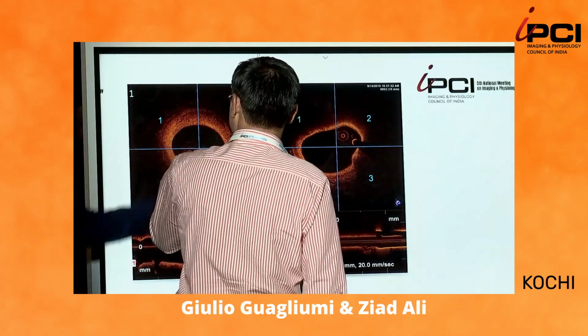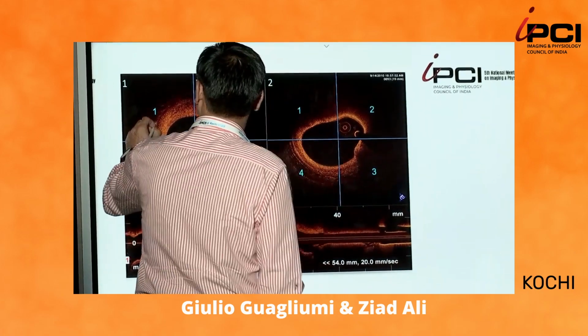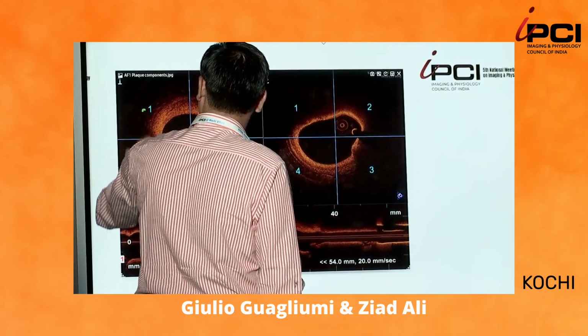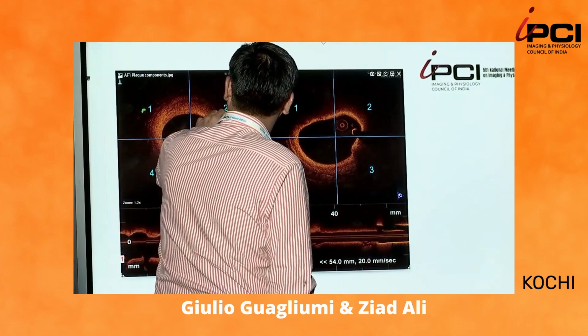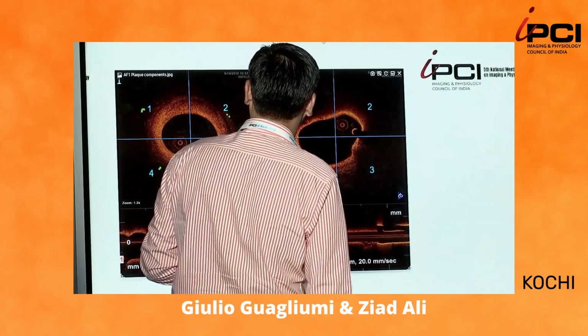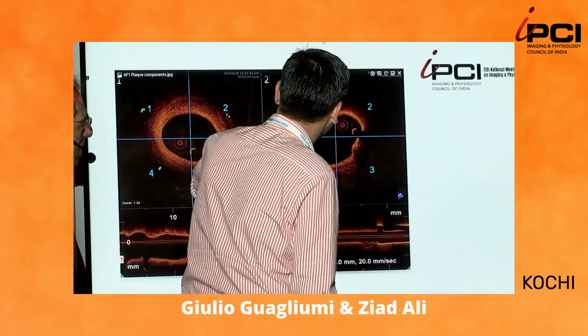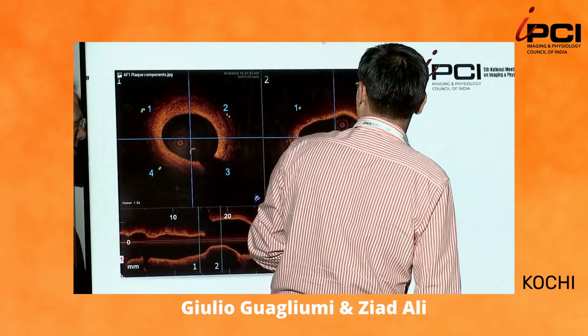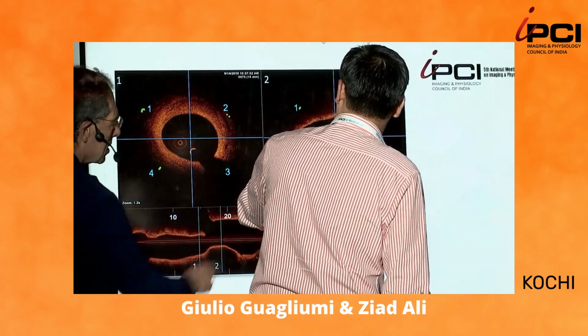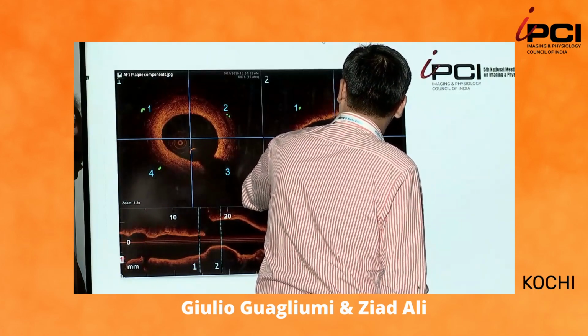And you mark it for all the quadrants, meaning they are all the same? Which one is lipid? Okay. Where there is the L, where there is not the L? In this image? Okay.